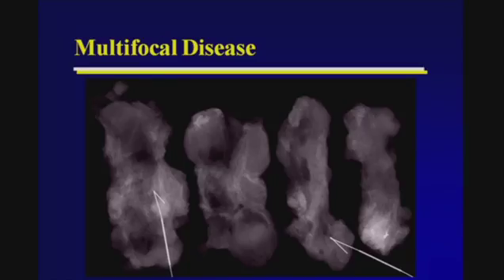Here would be an example of multifocal disease, and the patient has been going for breast conservation. This is sliced specimen radiography. We took the specimen and then we sliced it like a salami. So here's one lesion with the localization wire, and here's our second lesion with our clip marker. Here's the wire, and notice how on the sliced specimen radiography this lesion is close to the margin here.